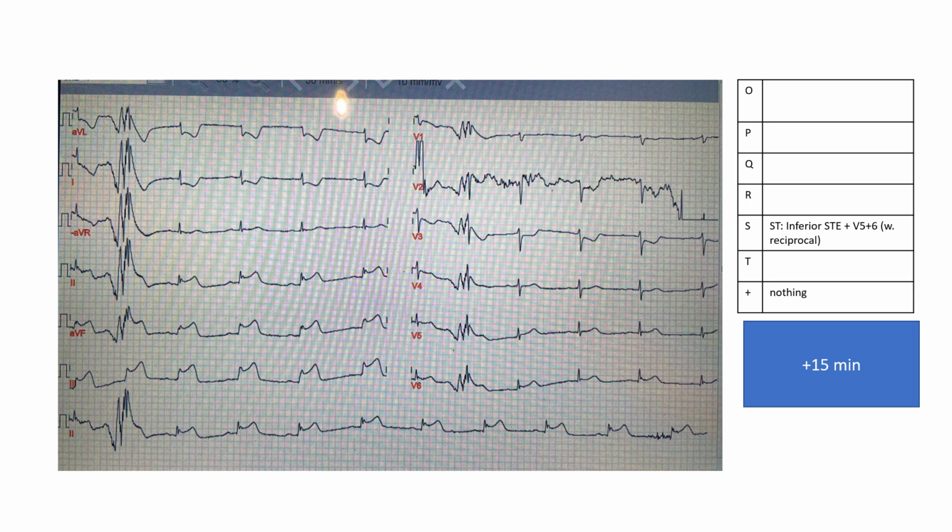Okay, and what if we did a POCUS? Then we would think that the inferior wall towards the right side of the heart may be moving less. We could also, depending on the history, entertain the idea that the chest pain was not specifically angina, but more like aortic dissection, and we could think of other pathologies for this, right?